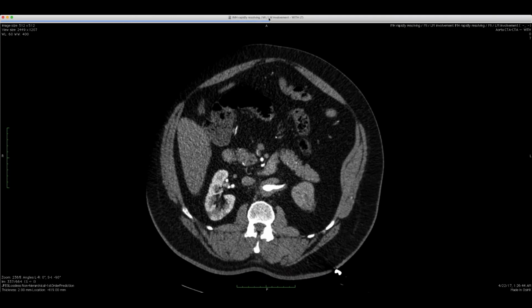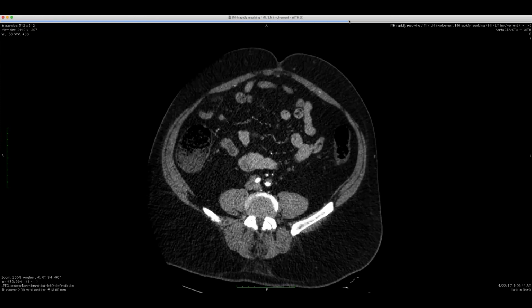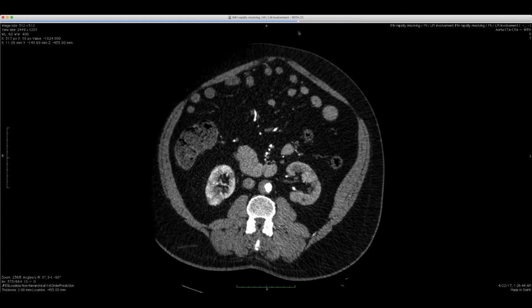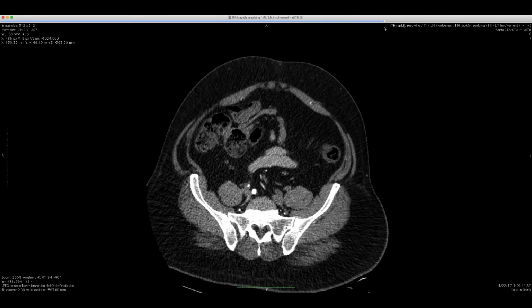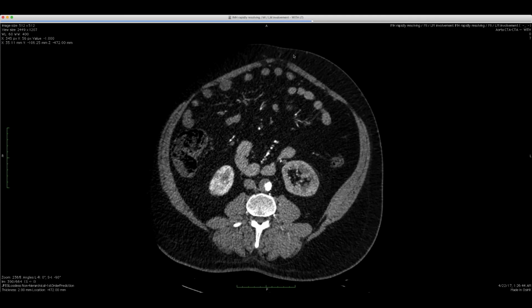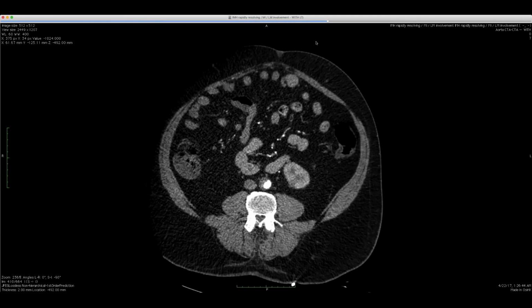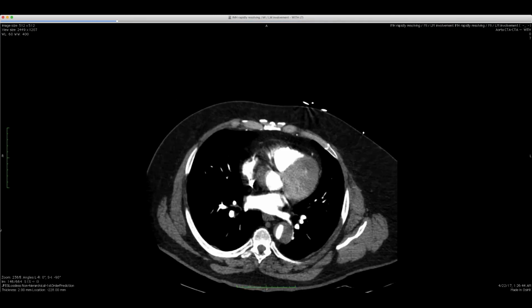but extensive, what could be said to be an intramural hematoma perhaps, comes down, goes into the SMA, goes into the renal arteries, but then you start to realize that it goes farther than you expect. This is well into the inferior aorta, goes all the way down, extends to the iliacs where there's compression of the external iliac, and it looks like almost occluded external iliacs there. So I don't know if you'll have seen intramural hematomas this extensive before, but something weird is going on.